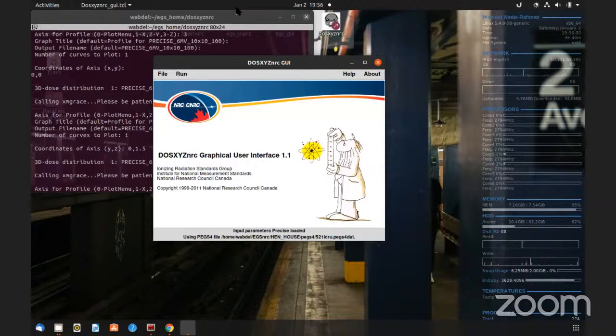Is it for, let's say, a simulation at 100 SSD? What was the field size? Try to keep this information in the file name. It's better. At the beginning, okay, but once you have to, my suggestion is better.